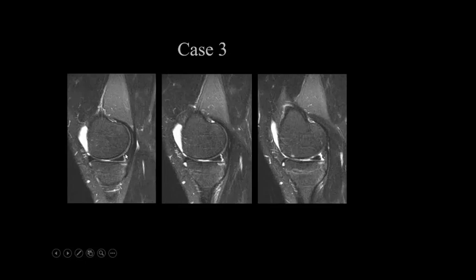So this is called the meniscocapsular junction. Normally you should not really have fluid between the capsule and the meniscus. Remember what we said earlier, that the medial meniscus is more fixed and less mobile than the lateral meniscus. The reason for that is the capsular attachment, which keeps the meniscus fixed in its position. It doesn't move.